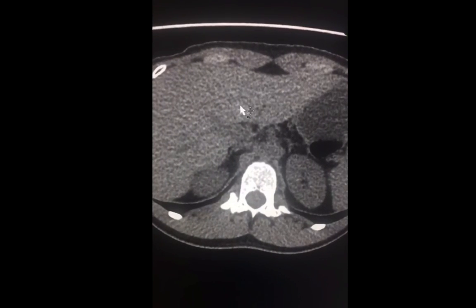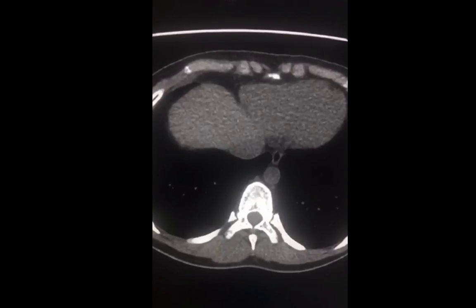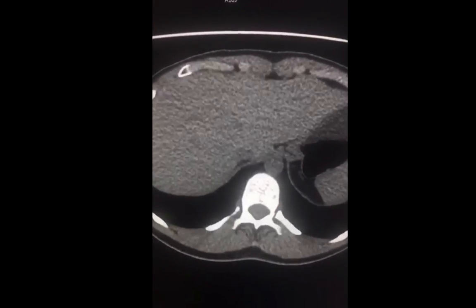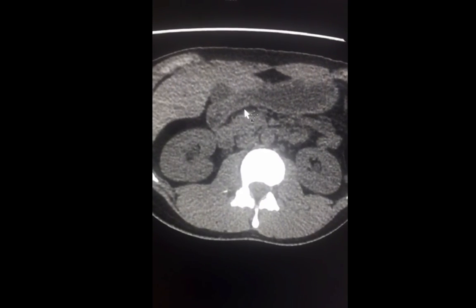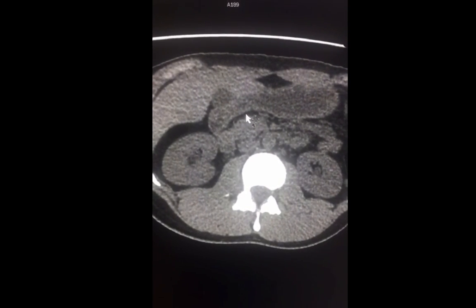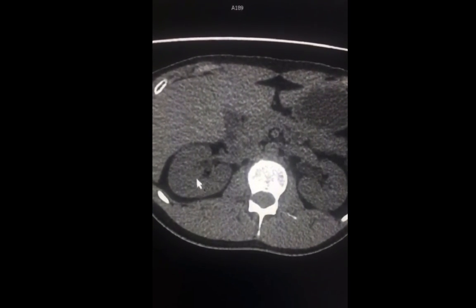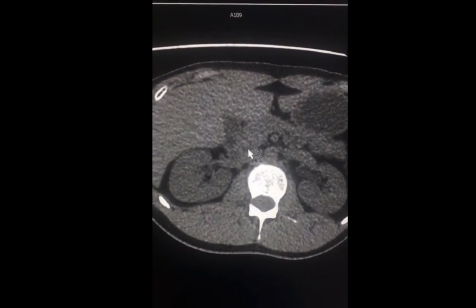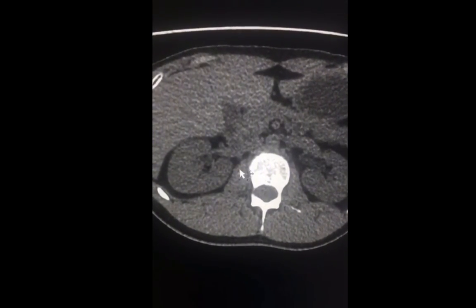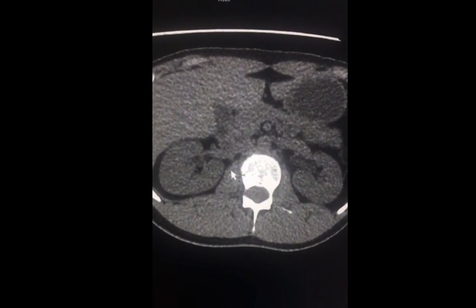This is a young patient who presents with right flank pain. So a CT scan of the abdomen and pelvis without contrast was performed. This examination is very common, also known as CT-KUB, kidney, ureter, bladder. This is done to assess for stones in the kidney or the collecting system, and since stones are calcified, we do not give IV contrast. Giving intravenous contrast could obscure underlying calcified stones.